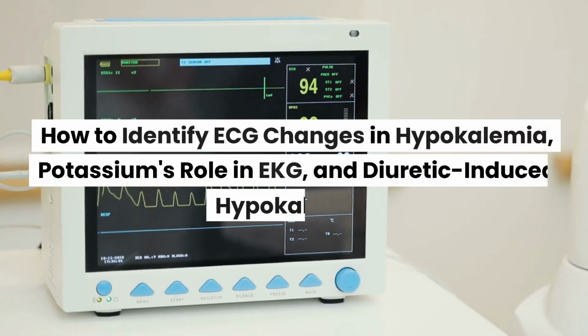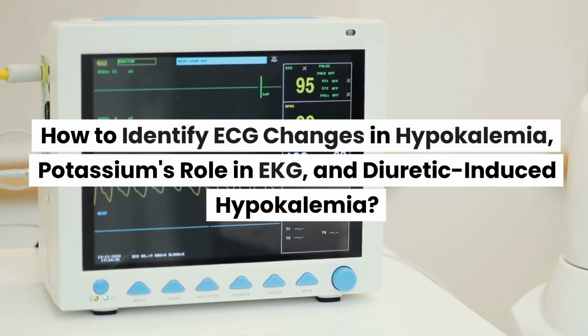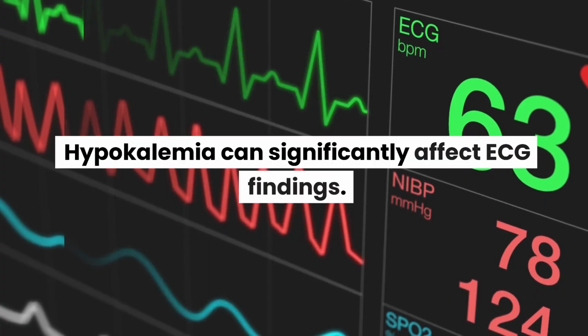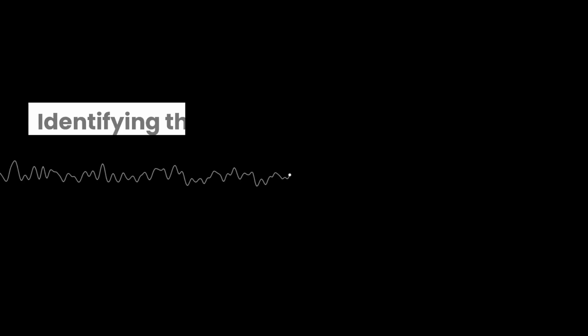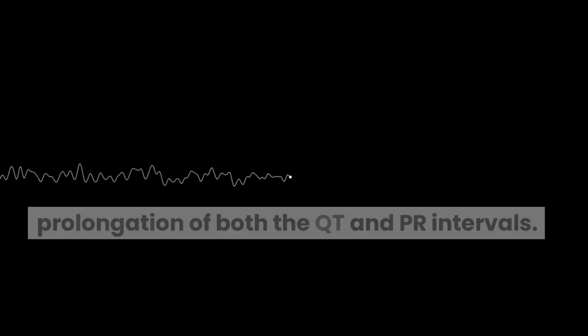How to identify ECG changes in hypokalemia, potassium's role in EKG, and diuretic-induced hypokalemia. Hypokalemia can significantly affect ECG findings. Identifying these changes includes looking for ST depression, decreased or inverted T waves, increased amplitude of U waves, and prolongation of both the QT and PR intervals.